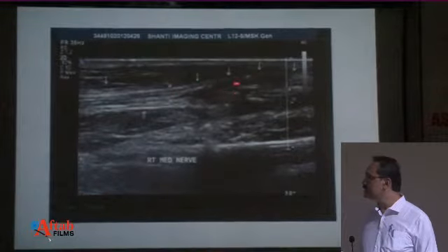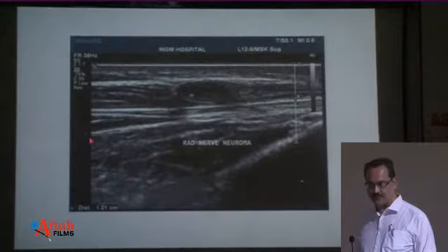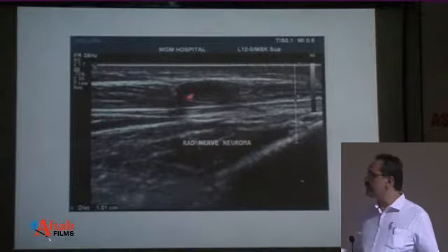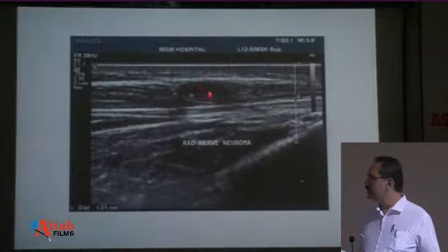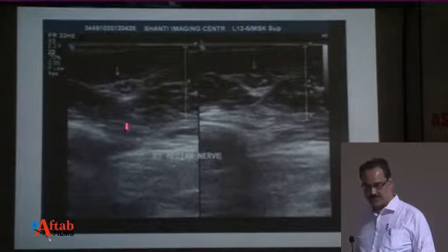Another case which is showing injury to the peripheral nerve. And again, after a few months, you can have a neuroma formation. That is because of injury. Localized dilatation of the nerve, the endings are well seen, and there will be degeneration, and the rest of the nerve fibers are well seen.